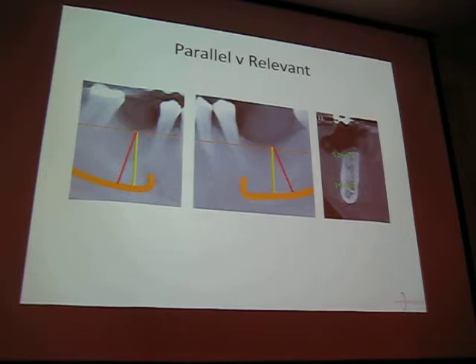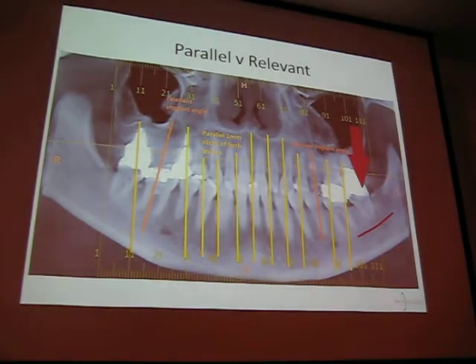Is it the yellow or is it the red? And that can be a really important question based on the angle the patient was scanned in the machine, their curve of Spee and the slope. All of a sudden, it's an extremely important question.